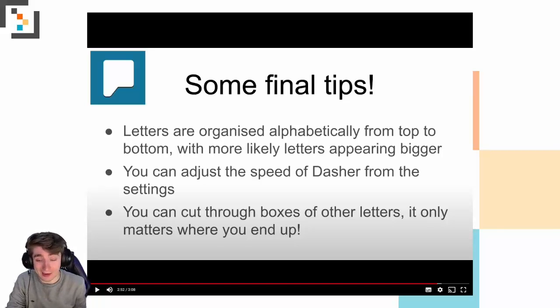Another thing is that you can just cut through the letters of other boxes. It only matters where you end up. Letters are selected once they move past that middle point, so you really can just cut across whatever you need to get to where you need to go.